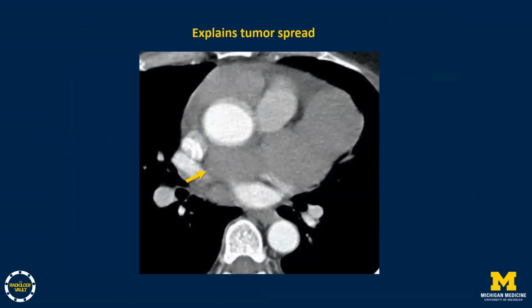On this first example, we see this soft tissue in between the vessels. Now we know that it is a pericardial mass along the right and the left pulmonic recesses, and probably also along the transverse sinus, which confirms its pericardial location.